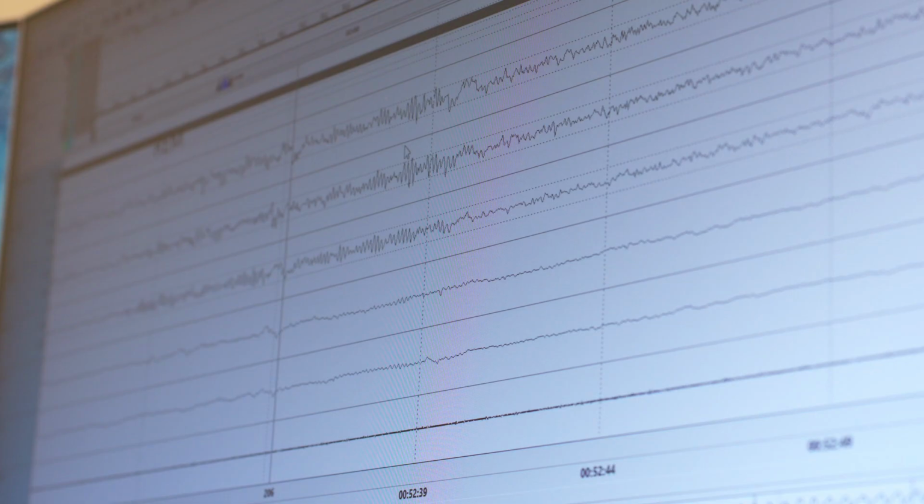And then the chin. REM sleep, that's the most relaxed state during all the sleep stages. So for us, the EMG is also always very important because it's practically at zero, a flat line. Right, at zero, yes, definitely at the lowest level of the entire recording. But we don't quite have that here yet. I'll speed things up a bit. You're really allowed to do that in this case.